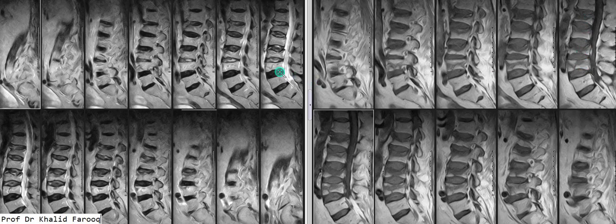Here we can see marrow changes on sagittal T2 weighted sequences as well. There is a mild bulge of the posterior body line, especially of the L3 vertebra. Here we can also see that the pre and paravertebral spaces show normal fat planes, and we can also see that the end plates are not eroded, rather they are compressed by previous trauma.